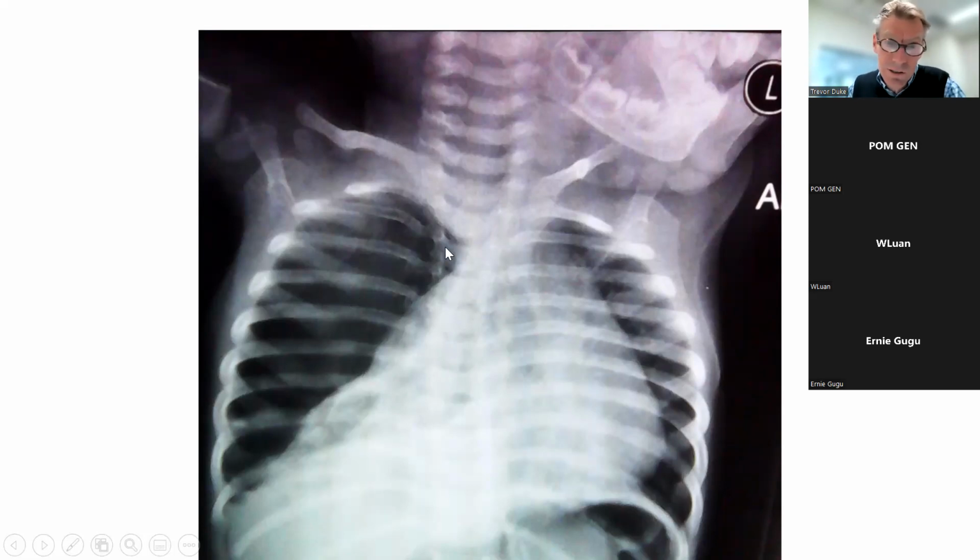and there wouldn't be such an appearance of asymmetry of the chest. This probably isn't a pneumothorax, but sometimes when you've got an area of collapse, then you get an area of hyperinflation above it, because the right lower lobe is full of mucus or secretions, and that's caused collapse with an infection there.